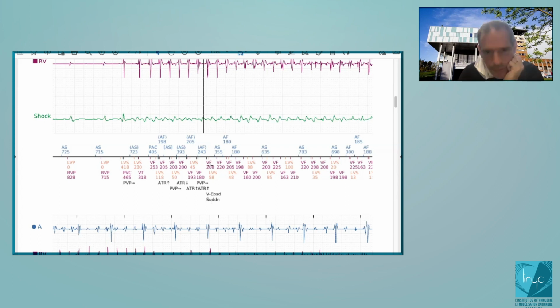And on this cycle, we start the duration, the initial duration for the initial detection of the VT zone. You understand? Is this clear? Yeah. On this cycle, you will start the duration for the VT zone, initial duration. But if you wait one additional cycle here, then you have 1, 2, 3, 4, 5, 6, 7, 8.